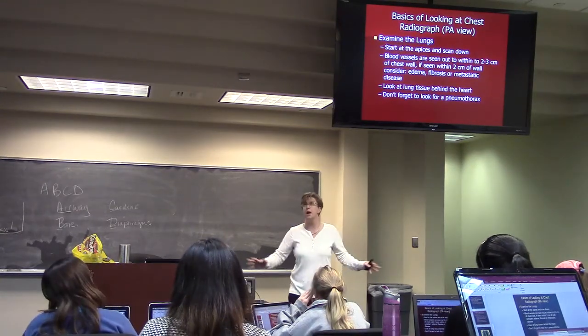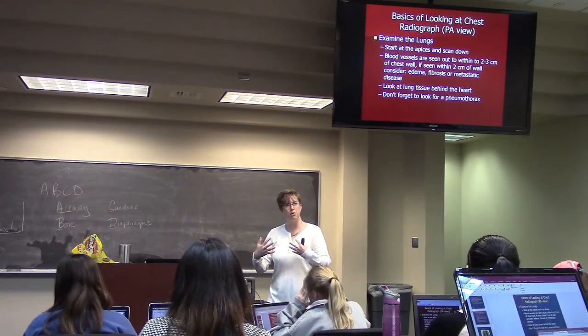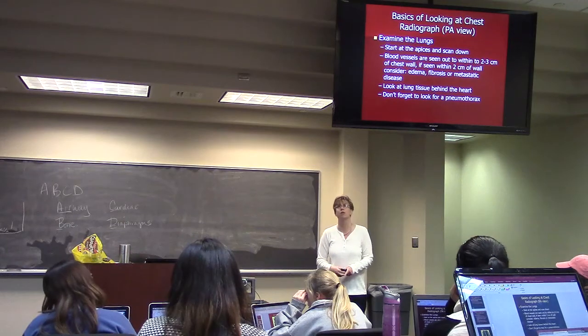Look at the vessels going out. Look at the tissue behind the heart. You should be able to see through that heart a little bit. There's some density that looks different there. There's something going on behind that heart.